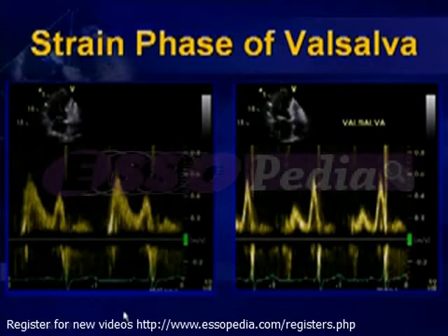Now, hemodynamic manipulation and its influence on the mitral inflow velocity pattern may therefore be useful to help further characterize LV filling, demonstrating again that the mitral inflow velocity patterns are really a dynamic continuum, with a pseudo-normal or grade 2 pattern during the strain phase of the Valsalva maneuver, which lowers left atrial pressure, may then unmask the underlying impaired LV relaxation.